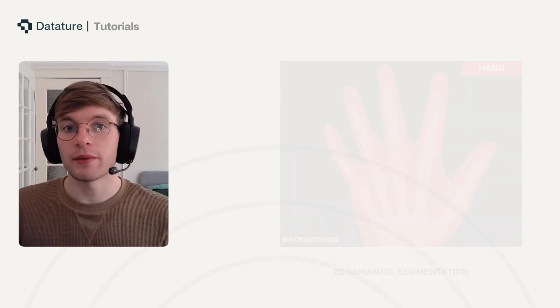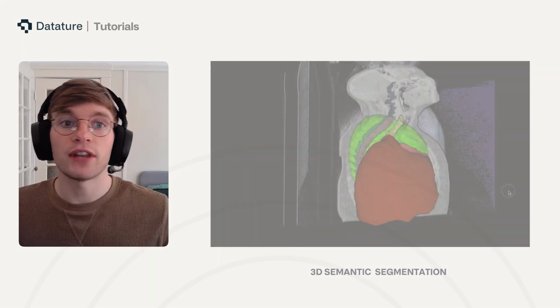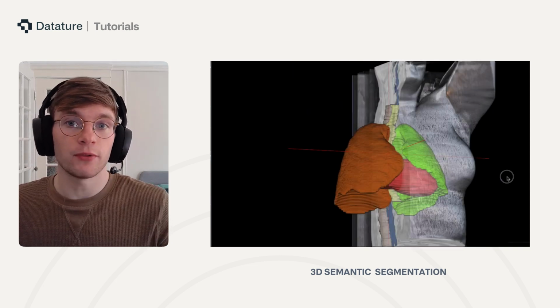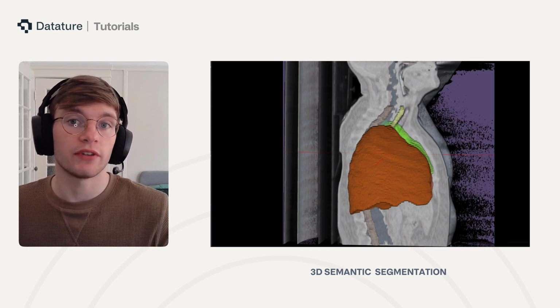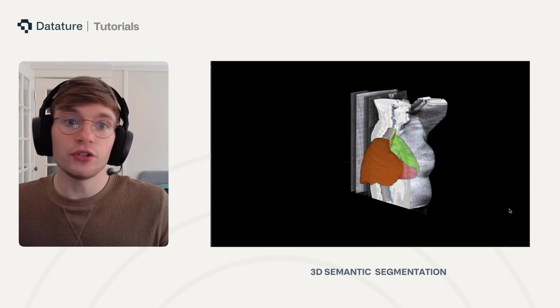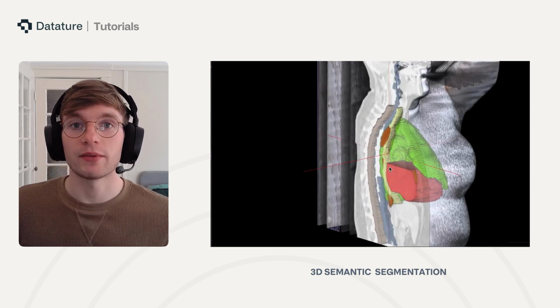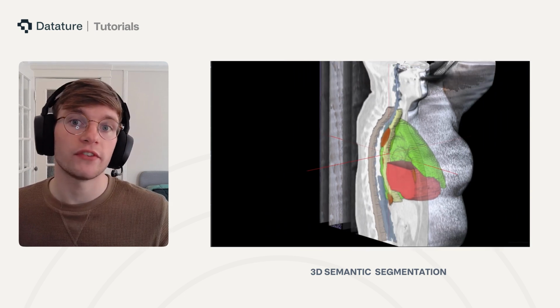In 3D medical segmentation, there are a couple of changes. Other than the specified domain, we are now handling volumetric inputs rather than the usual 2D image. Subsequently, we are now classifying individual voxels, or a three-dimensional equivalent of a pixel, as being a part of an object or class. Such a use case would be tumor segmentation, spine segmentation, or organ segmentation. However, today, we will be training a model for multi-organ segmentation.